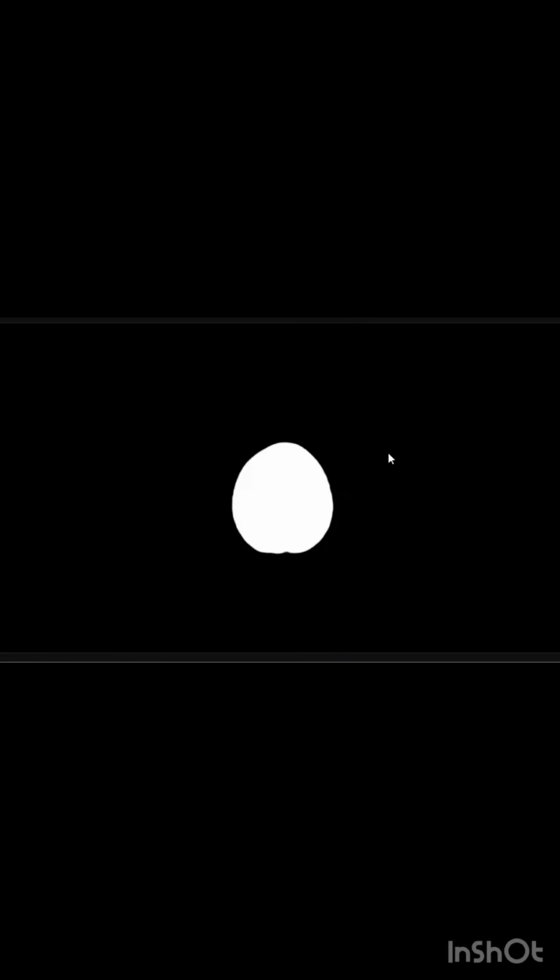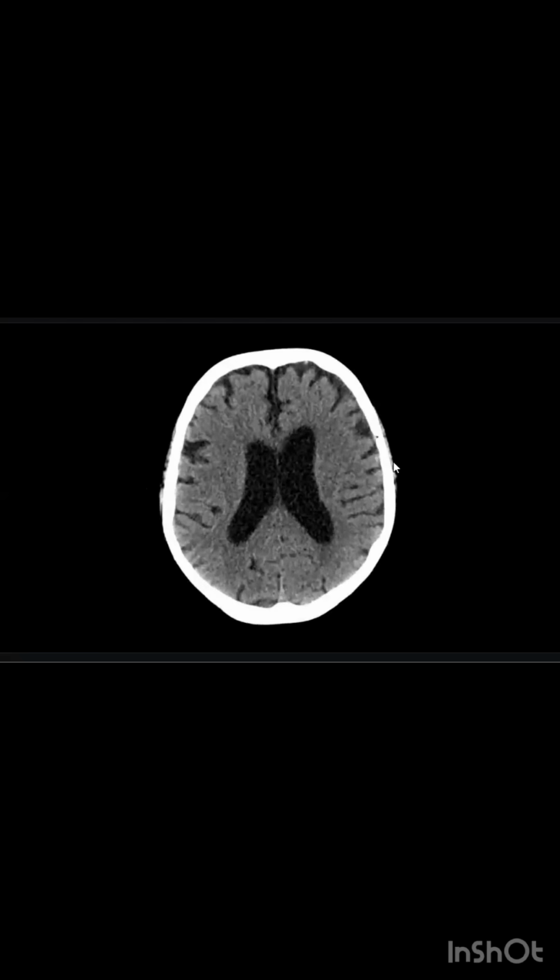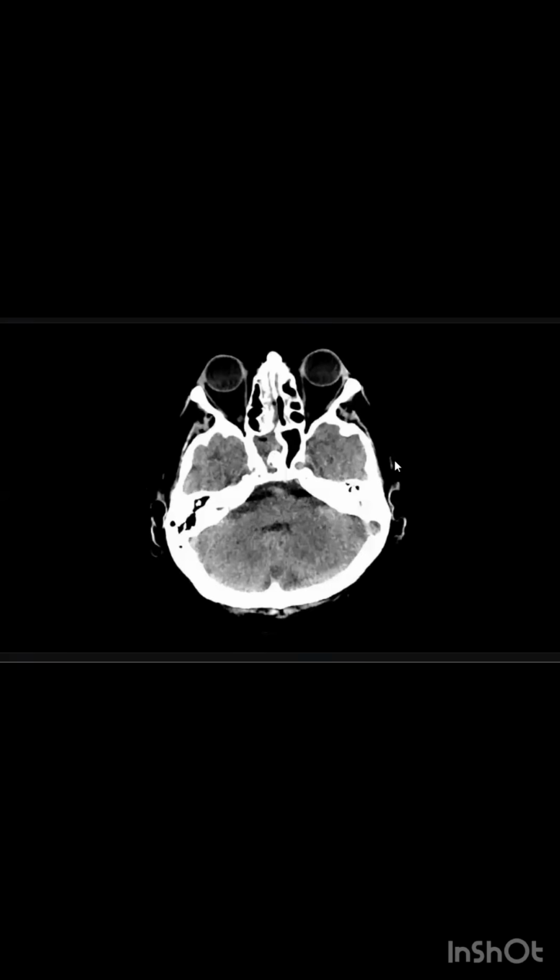Your case: a 70 year old male patient with multiple falls, confusion, and altered coordination. I'm presented with CT scan axial sections, unenhanced study. First, I will scroll through the whole stack of images, then I will start describing my findings.